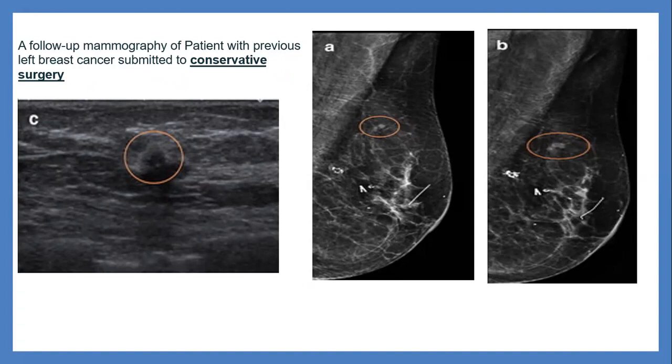I don't remember exactly, but the second mammography may be a short-term follow-up. If it's short-term follow-up, it demonstrates an interval increase in size, because both seem to be MLO. Okay, interval increase, and the ultrasound.